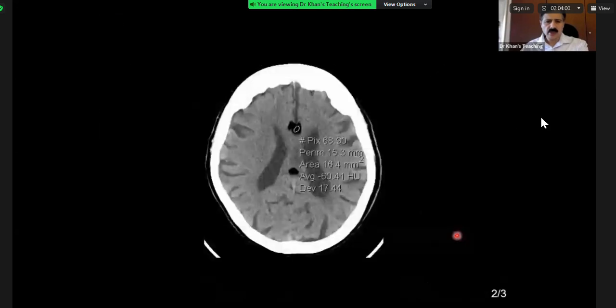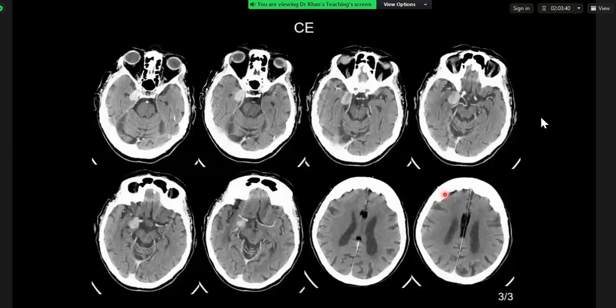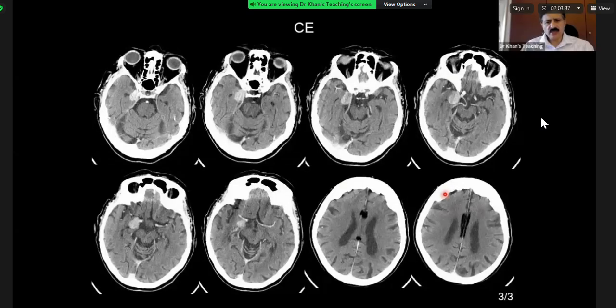And on this, in the exam, you will ask for Hounsfield units, and you can check it, and you can see that it was fatty density. But this is with contrast, and your conclusion is? It's an MCA aneurysm. Okay, and it might be on these axial slices. It's very difficult to be absolutely sure because the aneurysm is very, very big. Yeah. Might be at the junction of MCA and the PCOM.